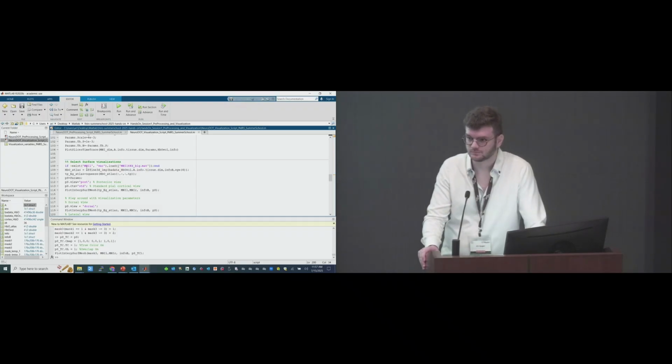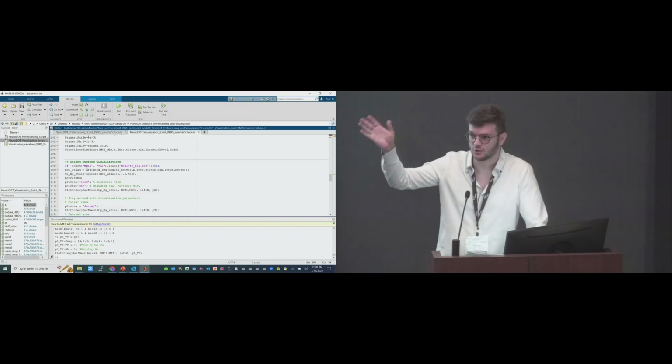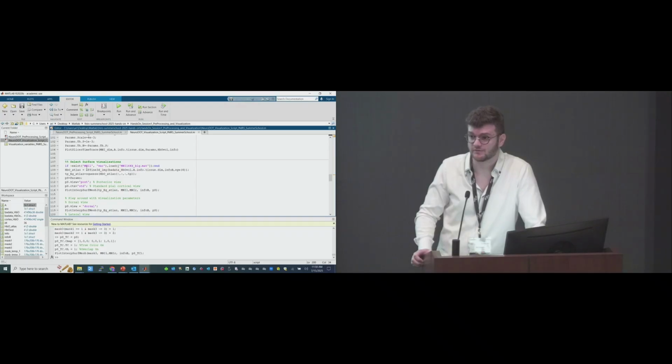If you do photogrammetry and you have a 3D type model, you can load that in there too. It may not necessarily be a brain, right? But you could still project it onto that subject-specific model, looking more at the head, not necessarily the brain. So that's possible with this here? Totally possible. The limiting factor is having the correct affine transform to go from your model space to that surface space. It's easier when you're going from MNI volumetrically to MNI surface-based, but as long as you have the affine transform that goes from one to the other, you can do it. Okay, cool, thanks. No problem.